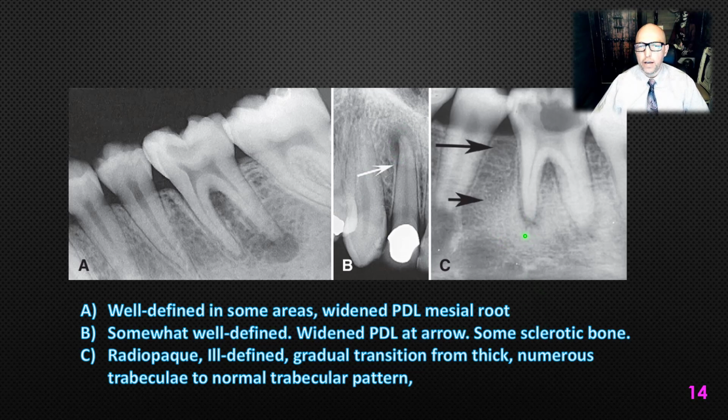So contrast that, you have your anatomy now, you know what a fossa looks like, you know what the lateral fossa looks like. If you see a radiolucency where you suspect a lateral fossa, and you don't see that PDL space kind of widening around and enveloping the periapical lesion, more likely that it's just the lateral fossa. But in this case, does it look like that or more of a periapical lesion? Yeah, we see the PDL space widen and kind of form this lesion going around the tooth, that's clearly a periapical lesion. This shows more of a sclerotic lesion, so what do we call that?